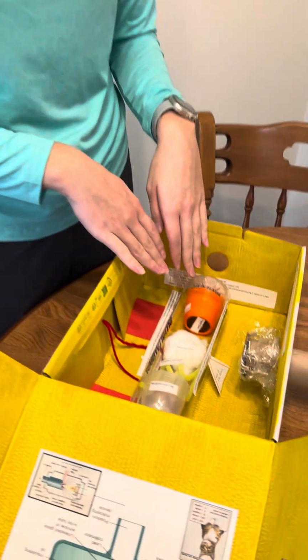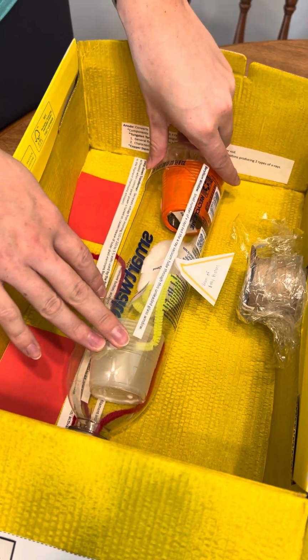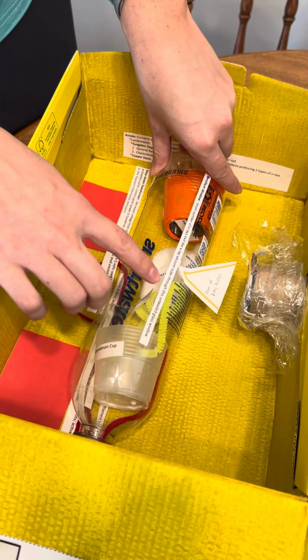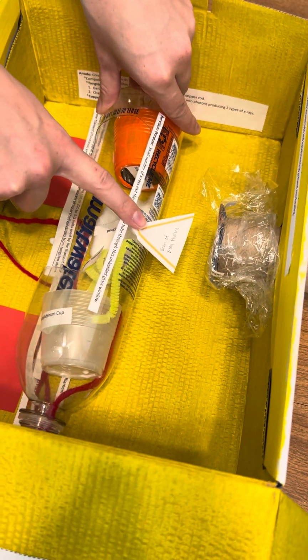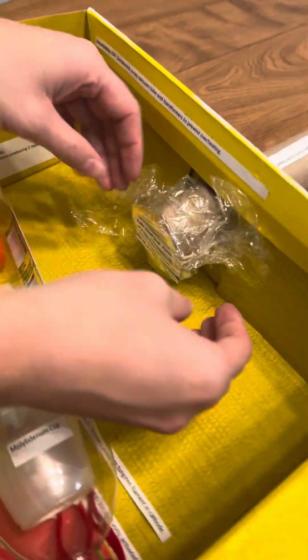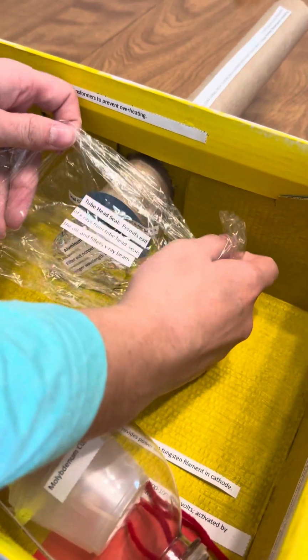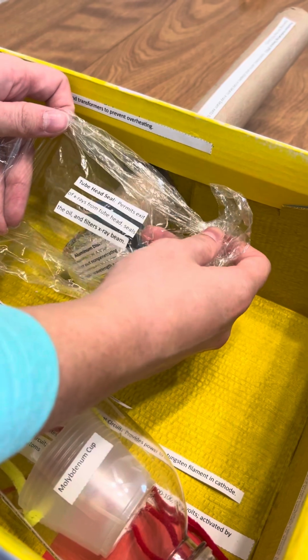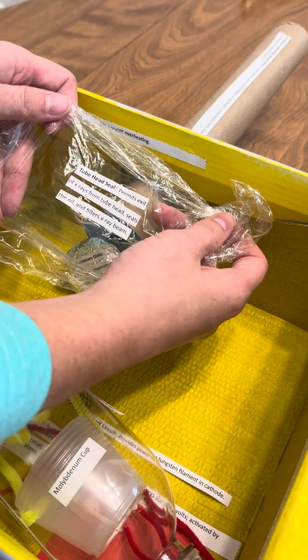Hi, I'm Olivia, and I'm going to be going over how the X-rays exit the tube head. Once they've been generated inside the vacuum tube, they're going to exit through the beryllium window, which lets a small number of X-rays through an unleaded glass window. As you can see here, the beam of X-ray photons go out towards the PID, and to get out of the tube head, the first layer the X-ray photons are going to come in contact with is the tube head seal.